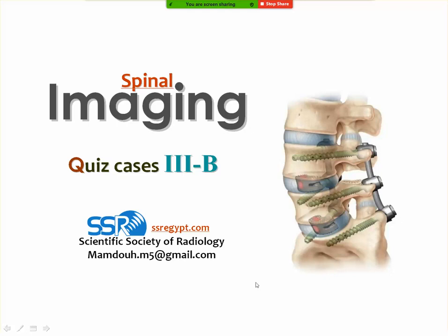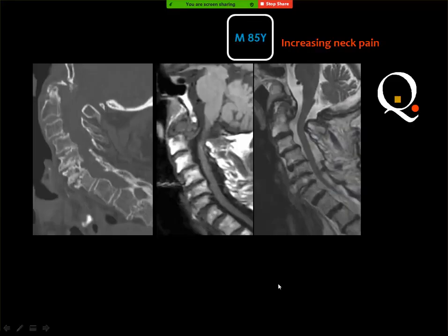Continuation of these quiz cases, and we stopped here, where you can see a cervical CT and also degenerative arthritis. Sorry? Degenerative spondylodiscitis, you mean?